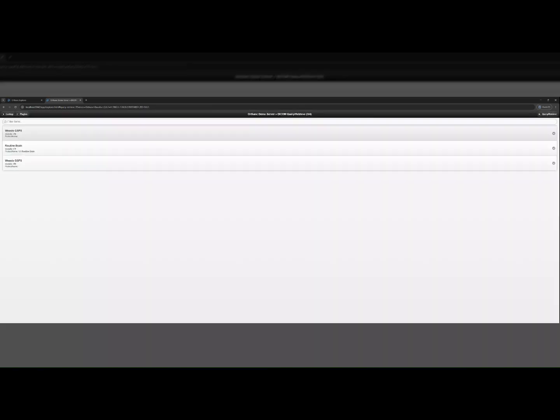So I would click on retrieve. I would wait a little bit while that retrieval actually happens, and as long as everything's good, we would get that study and that patient available to us within our system as well. If it didn't work, you would have gotten an error code.